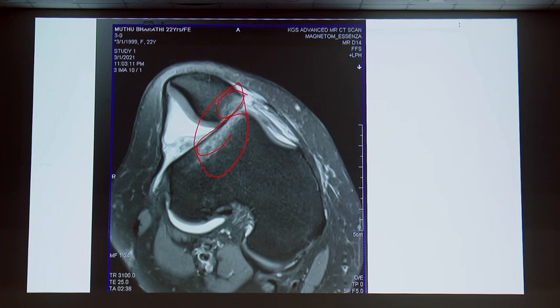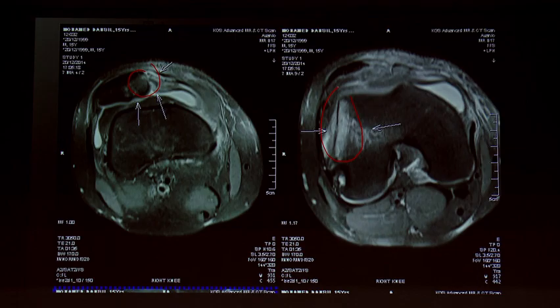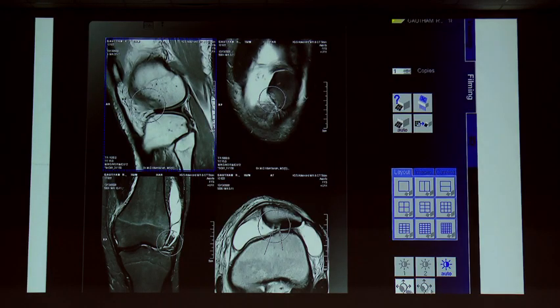And whenever it is kissing contusions, always you can see here, this is another patient, you can see the medial patellar facet and you can see the lateral femoral condyle injury. And you can see the coronal images, you can see the patella, this is the inferomedial patellar facet, it is injured, and in the femur, it is the lateral femoral condyle. So these are the sites where we have to carefully look.